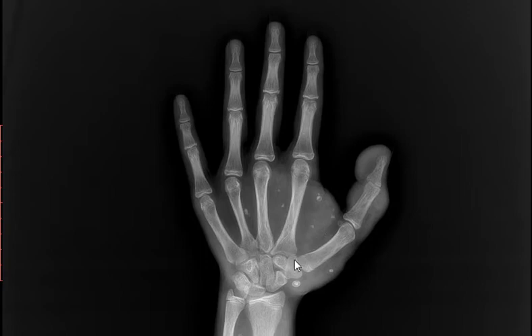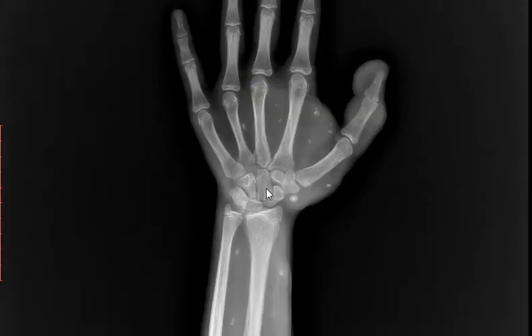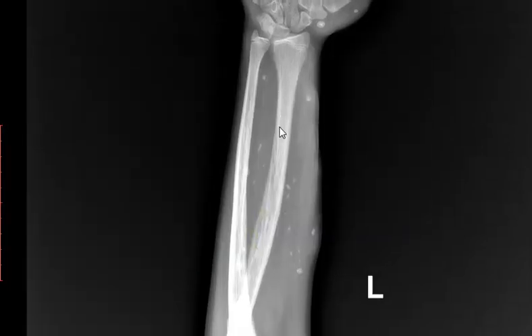So what are these calcific spots called? They have a name. Phleboliths, exactly. These are called calcified phleboliths. Do you know what that is? Yes, inside the vein. It's a calcified vein. So calcified phleboliths with soft tissue swelling in the hand, mainly in the thumb and the radial aspect of the palm. It's long standing, and even the forearm. I'm just zooming. Even the distal forearm, in fact all the forearm contains calcified phleboliths.